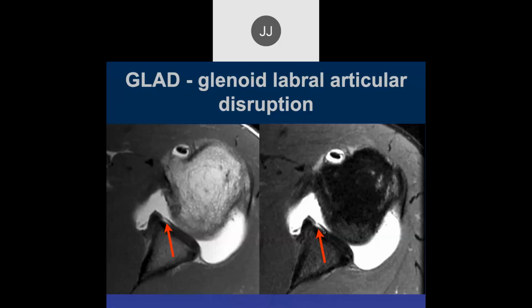Yeah, so this is a displaced piece of cartilage. Or delamination probably would be the best word. So this is a tear of the anterior glenoid. You need to measure what you think the size is, and it's a delamination undermining the labrum.